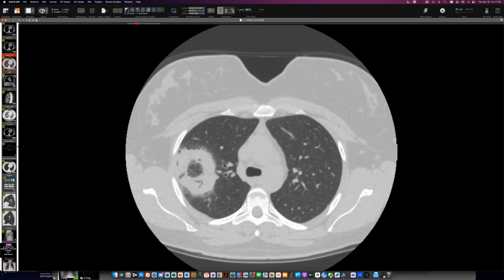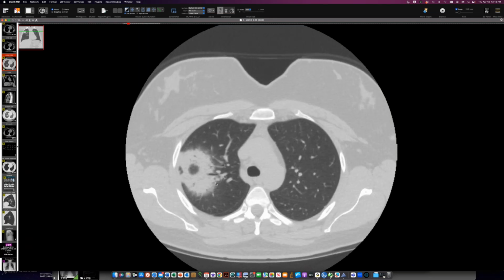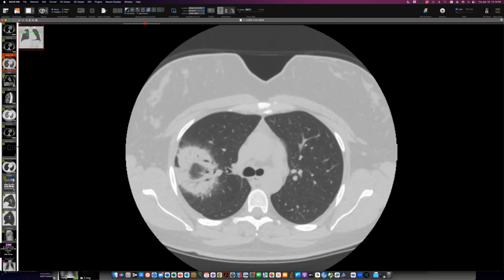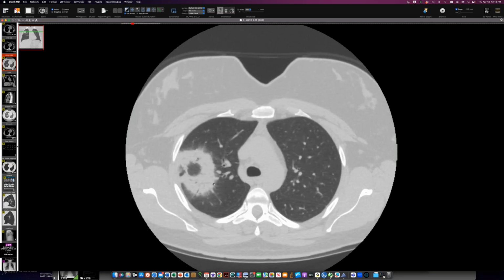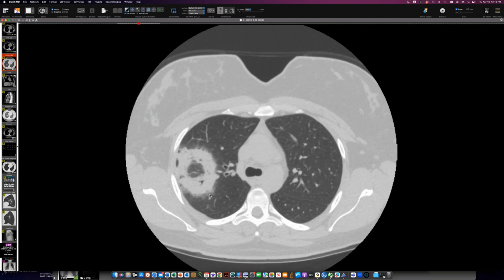So this doesn't look as aggressive as a typical mucor lesion, although it does have lots of bird's nest features here, but does have air bronchograms, which Jeff may disagree with me, but I think air bronchograms are not that common in fungal nodules. Now, Jeff is a specialist in blastomycosis, and that often looks like a bacterial pneumonia, so I'm going to cross blasto off my list. But the fungi that we see out here rarely have air bronchograms. So I'm going to state that categorically. I'm going to agree with you on that one, especially when it's like a mass or a nodule. Right. Okay. Super. Okay.